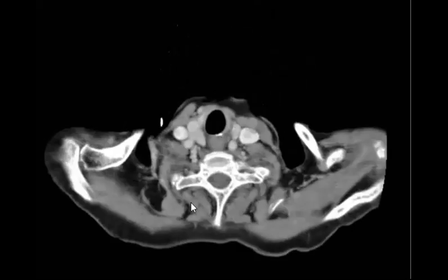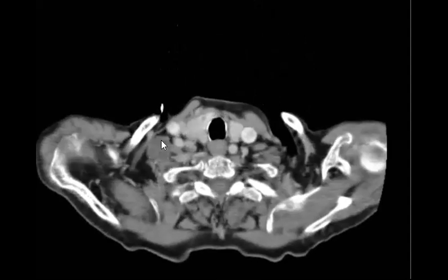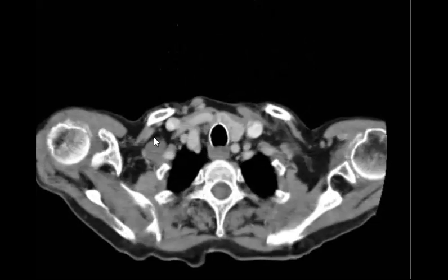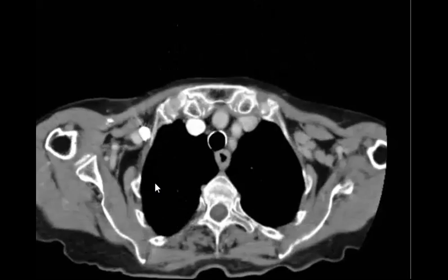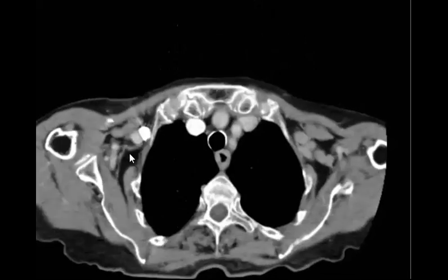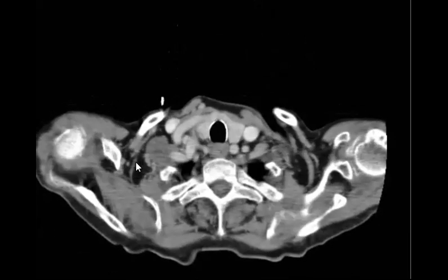Right, supraclavicular, perfect. Look in the fat plane here. Yes, this one. Sometimes when you go in this region, you skip it, or at least you don't focus, because this is the region where the axillary and subclavian vein or artery go.